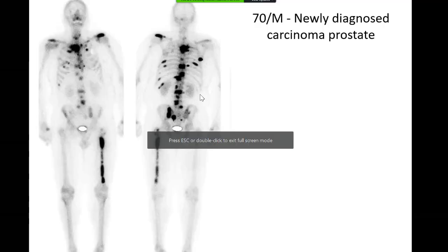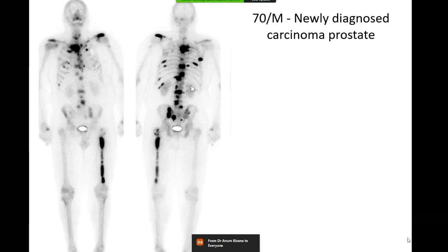You did mention the excretion from the kidney. Remember that kidneys would be seen normally, so there would be excretion from the kidney. That's why, if you remember, these scans are mostly done at least approximately 3 hours after the injection of the MDP. That basically clears the soft tissue, causes excretion to the kidney, and then you have a more preferential uptake in the bone.